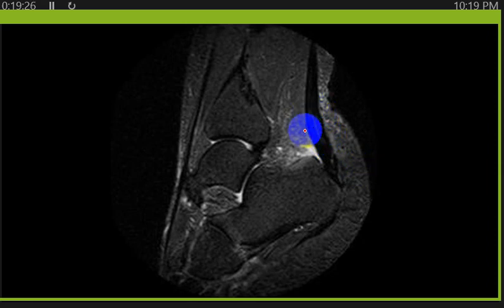This is the tendinopathy of the Achilles tendon, thickened, and some fluid in the bursa, the retrocalcaneal bursa, and the bony deformity of the posterior aspect, posterior superior aspect of the calcaneum. Okay. This is also Haglund deformity.